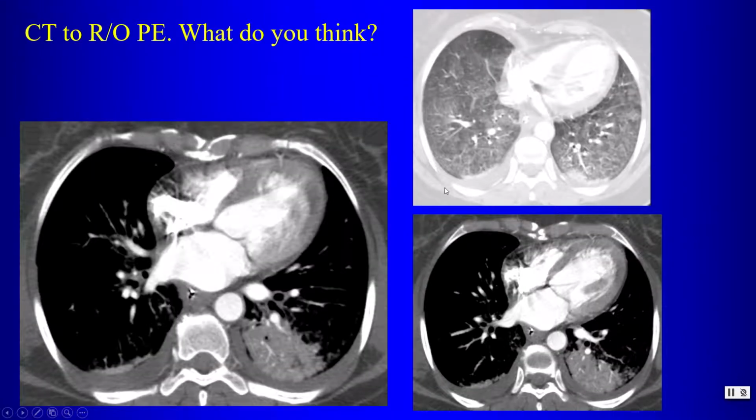But this patient with bilateral consolidations, here on the CT scan, we see these ground glass opacities and bilateral pleural effusions and some consolidation here in the left lower lobe. There is some mild interlobular septal thickening here. So this is another patient with pulmonary edema. Now, when we look closely, we can surmise the cause of the pulmonary edema.